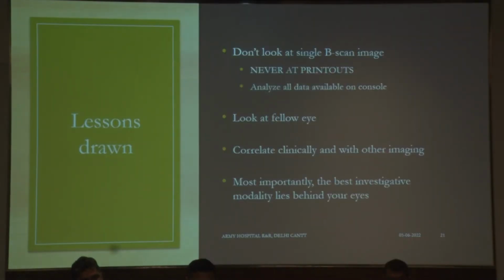So what are the lessons drawn in these cases? Do not scan in just one, do not look at a single B scan image. Never take out a printout. In case of any doubt, please go to the console and see all the scans yourself. Don't depend on just one scan, because the optometrist may have taken only one scan, and then you are not able to form a diagnosis.